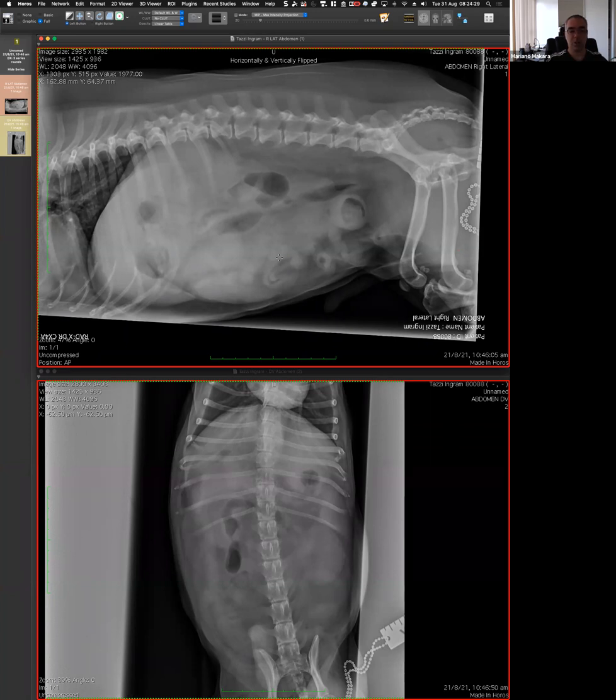You mentioned that you can see the colon, the descending colon there, and I agree with you. How certain are we? Very certain. Okay, cool. So if we are very certain that it's small bowel, let's continue on.